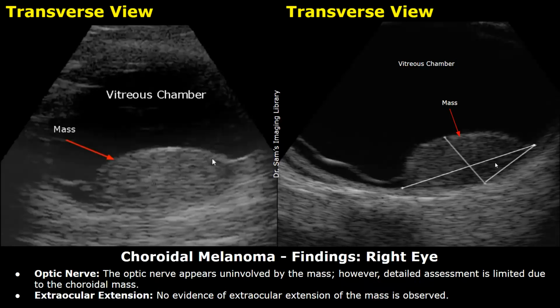The optic nerve appears uninvolved by the mass. However, detailed assessment is limited due to the choroidal mass. No extraocular extension of the mass is observed.